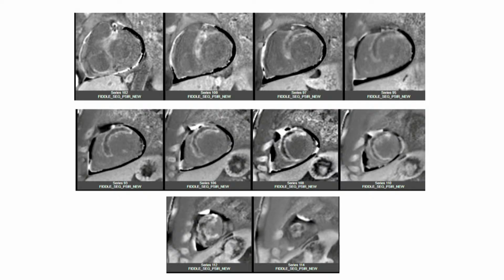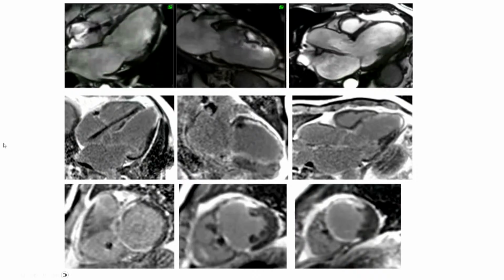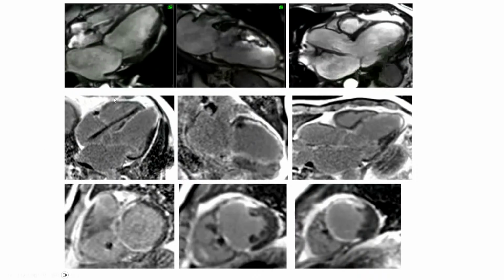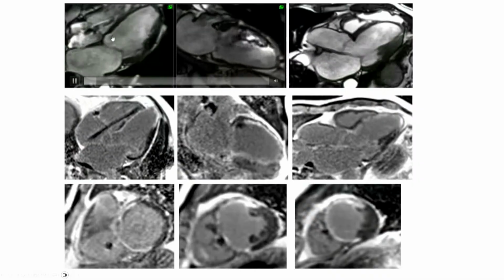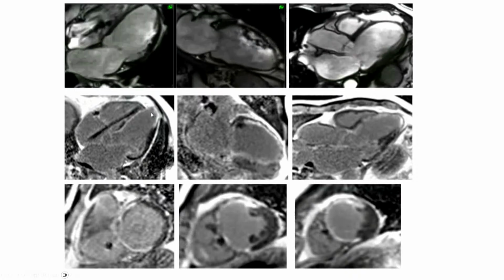So why does it look different from what you guys probably have seen when we show on the conferences, or even what we usually see a whole lot? I'm going to show a different patient just to show what we got used to seeing more often. So this is somebody with multivessel disease. As you can see, this is chronic. This is the very thinning around the RCA and LAD area. Only thing really working is the circumflex. And with that, the scars we usually see are a subendocardial scar or a transmural scar.